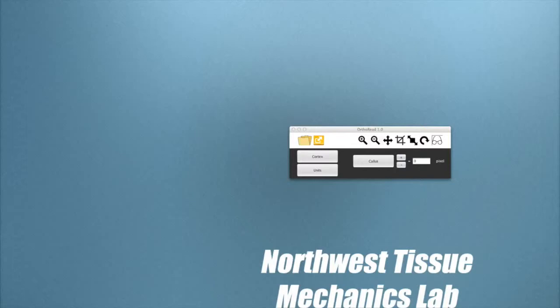Welcome to NTM Lab's basic video tutorial of the OrthoRead application. In this video, I will be giving a quick demonstration to provide the basic features of OrthoRead and show how it segments and quantifies fracture callus. First, let's open a digital X-ray image.